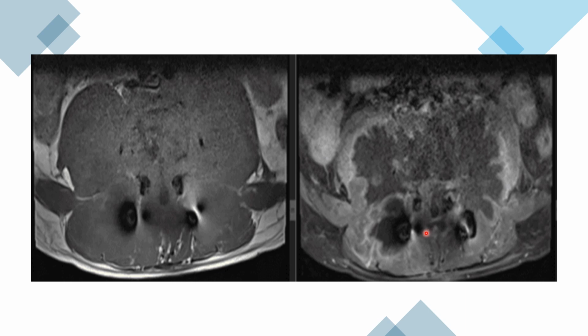And in the region of the lumbar spine, a similar mass was also seen involving the vertebral body and posterior elements. Furthermore, we can see hypointensities, and this was because the patient was operated on outside for a clinically suspected Pott's spine. Since there was no improvement, the patient was referred here, and we can see that the mass is showing enhancement on the post contrast images.